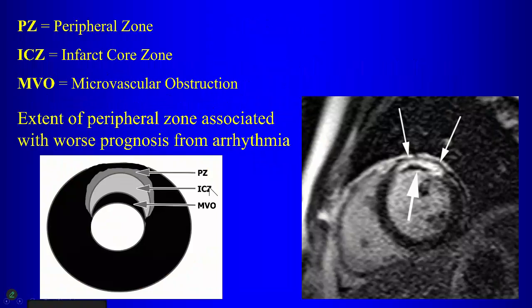So when we look at MR, then we can have the microvascular obstruction here, which is the dark area. Around it, the bright area represents the area of infarct. Of course, the microvascular obstruction is also infarcted. Right? And then when you look at T2-weighted imaging, this area around here might demonstrate edema, and that would be the area at risk, okay?